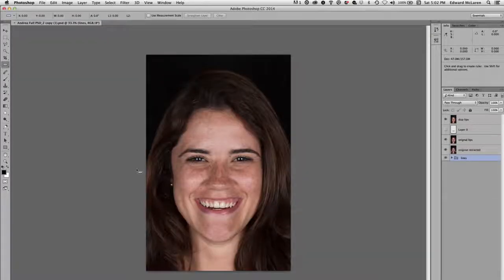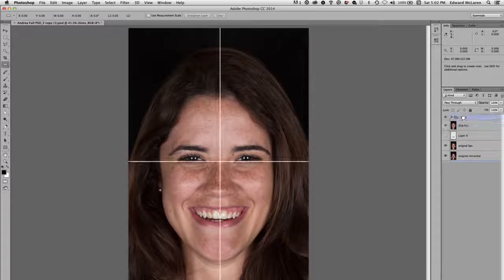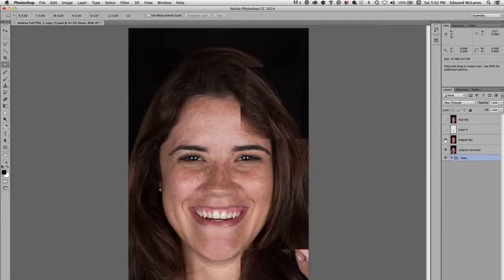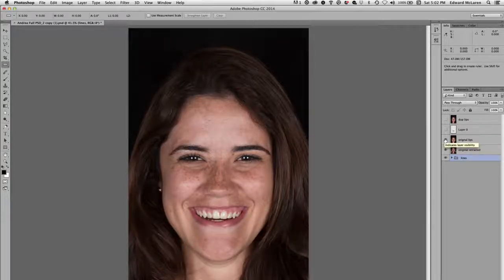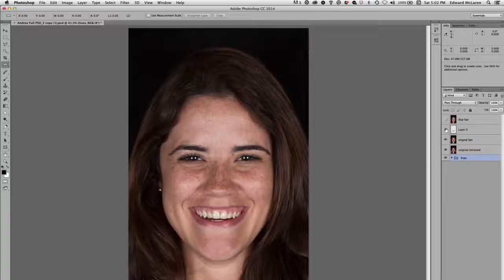And this is the image that we've already aligned using our lines from before, if you remember the lines from a previous section. So we've rotated the image. We've also aligned the lips on, essentially, a lips retracted view, what I like to call the digital incisal plane. All right, and then we cropped a set of teeth so that we could be behind, we could actually work on.